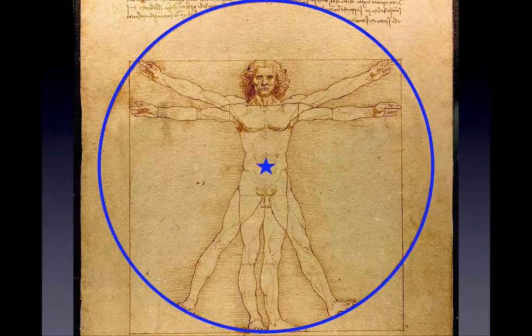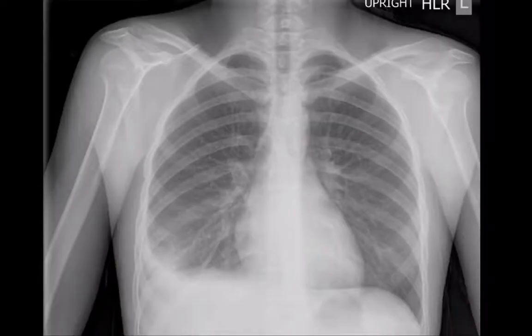So we scan, like I said, from eyeballs to ankles in the ER. And one of the clinical things that we do with ultrasound, which I think is pretty cool, we had this patient, she was a young female with a cough. She got this x-ray, and I'm not going to teach you how to read x-rays, but once you start reading radiology images, you're going to look at a bunch of normals, and you're going to see like, whoa, this is something weird. I don't know what it is, but it's not normal. If you compare it to the other side, you see that there's something going on there.